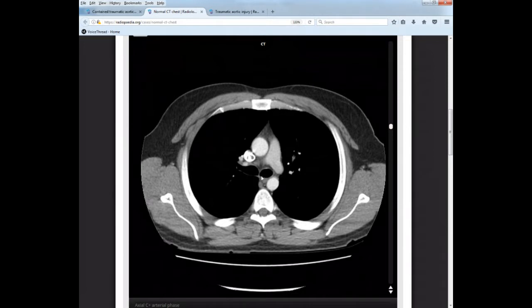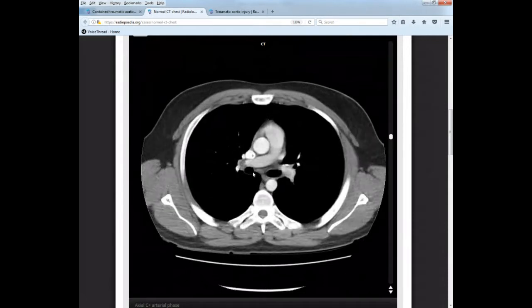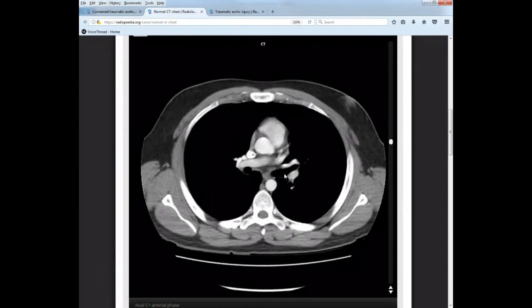So as I scroll down, you're going to see oblong. This is still our first branch of our right, but our right, you can see, is a nice circle, which means it's still traveling inferiorly. It's vertical, whereas our left is oblong as it's traveling horizontally, okay?